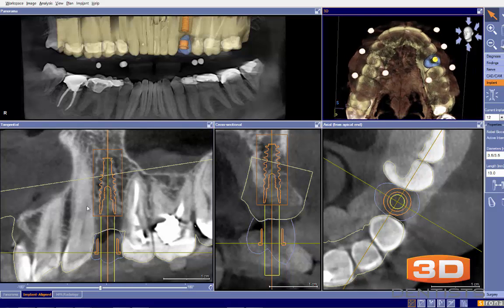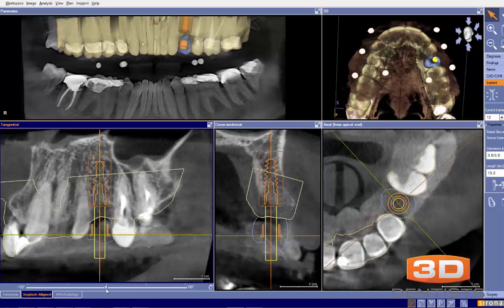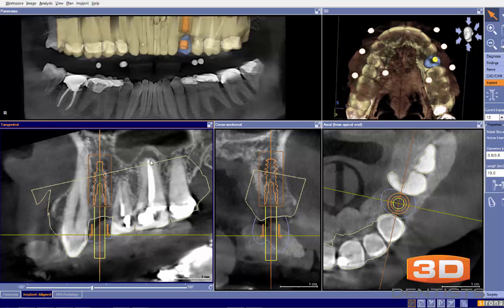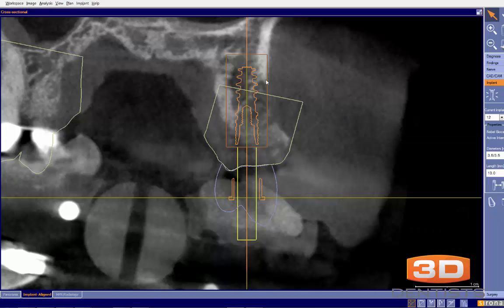And then the last thing I see in this particular plan of concern for me is, when we go through the 360-degree view, I can see that this tooth had been extracted, and I don't know when it was extracted. My guess would be relatively recently. You can see here on tooth number 14, there may be something going on with the palatal root right there. Could be a non-healed area, or a radiographically healed area. But my only concern comes right here. I'm not seeing my buccal plate completely go through there.